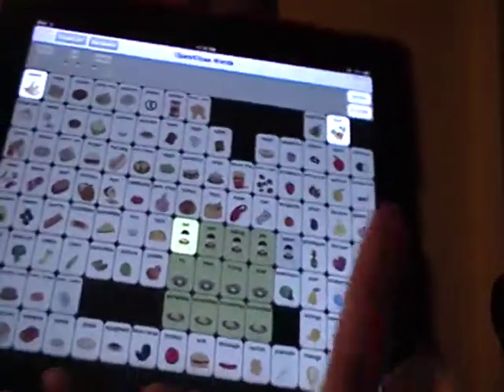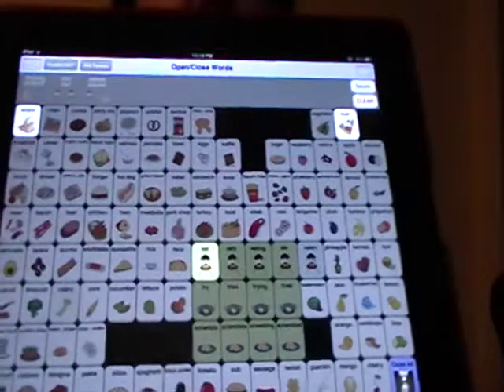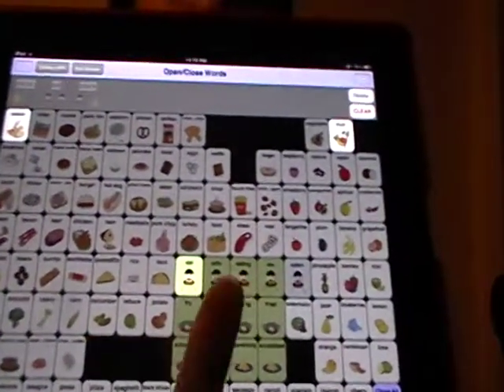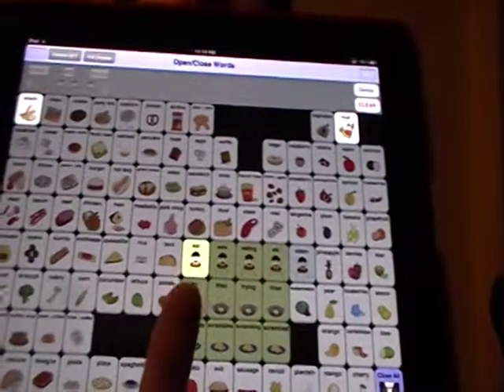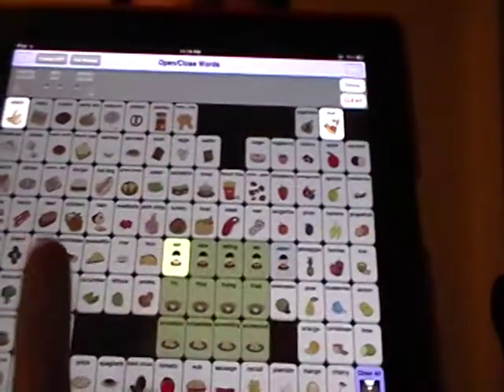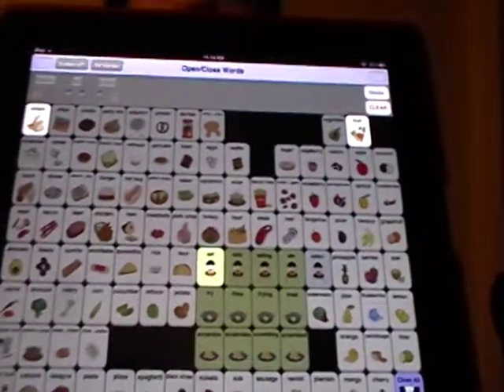So if you go here and you go to open, you can open any of this vocabulary also, but remember the only ones on these secondary screens that are going to work are these ones that are lit up right now. And the position's the same, so it's going to be whatever that core word is, and then those 2 buttons in the same place on the secondary screen.